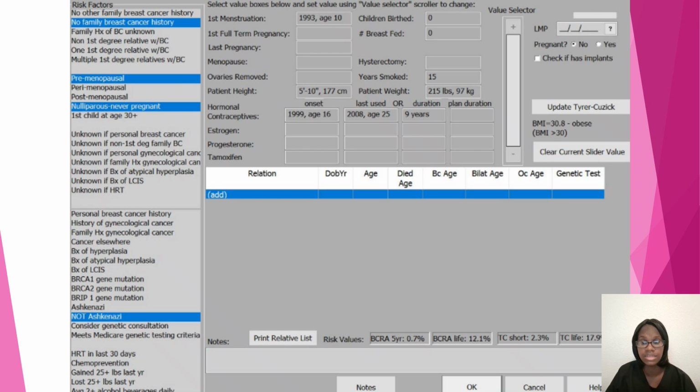it can alert the next tech, who should also be looking at the previous mammogram, but that doesn't always matter because someone may have had a mammogram in June of 2024 and went and got breast implants in April 2025. Now they are due for another mammogram in June 2025. So you can't always go by the last images. So just make sure that you always click update frequently to save the answers.